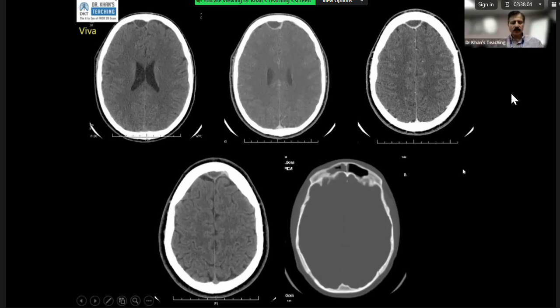Okay, that's fine. Now, this is a classical case for the exam on a brain CT. So these are brain sequences. The patient presented with headache and that kind of a thing. In your exam, you will pick this up: there is an enhancing lesion here. This is an epidural abscess.